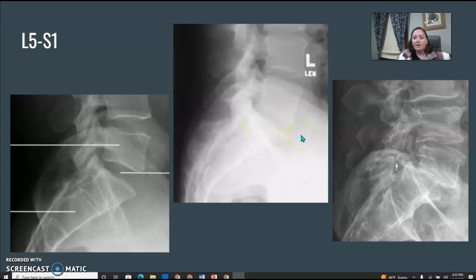What does that mean? It could mean that they forgot to tube angle, or that they needed a tube angle. So depending on that interiliac line and how the patient is positioned, did they have a sponge under their hip? Did you use a tube angle or not to open up this joint space?